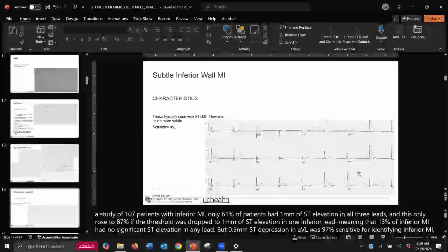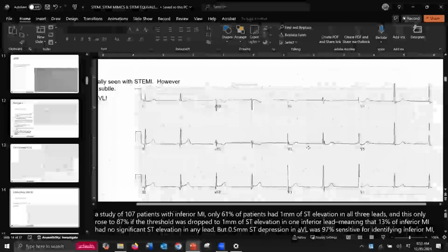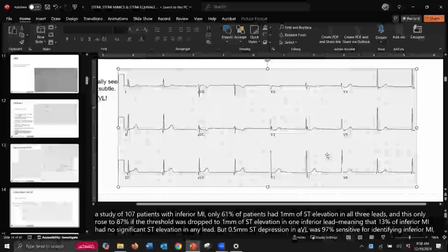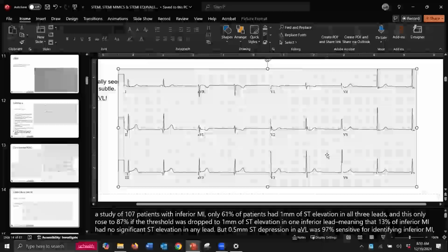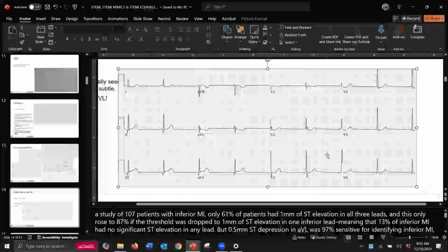So let's look at this 12 lead. And since I've got my zoomer inner kind of working, and I'll screw this all up, let's look at this 12 lead EKG. First of all, what's the rhythm? You don't see a P wave?